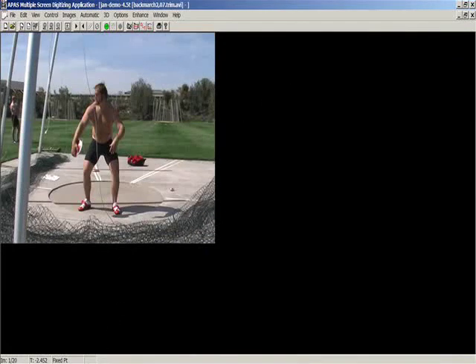It tells me to digitize the fixed point. I need some fixed point in the area. I'll select this one, so everything is relative to the fixed point. Then it tells me to go to the right foot, right ankle, right knee, right hip, and then the left foot, left ankle. It all tells me here how to do it. We'll go to the left knee.